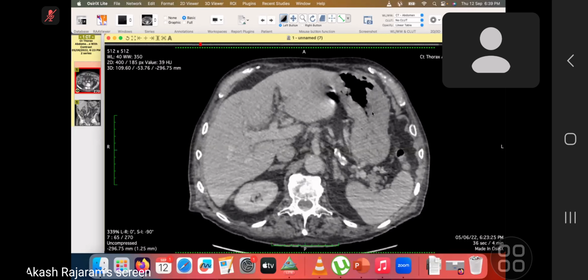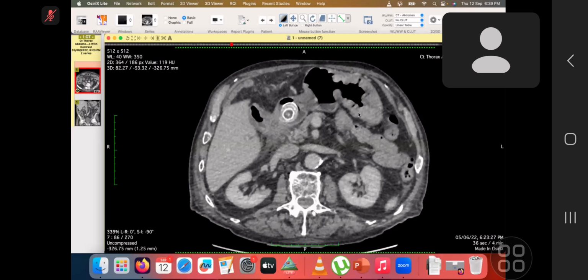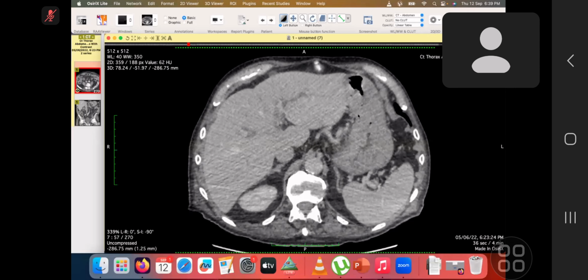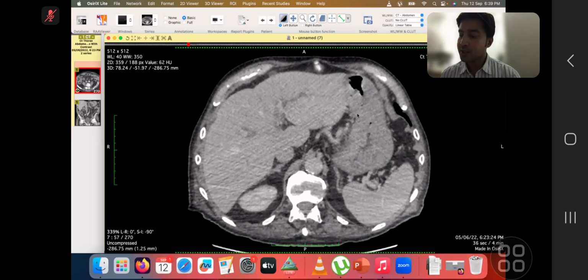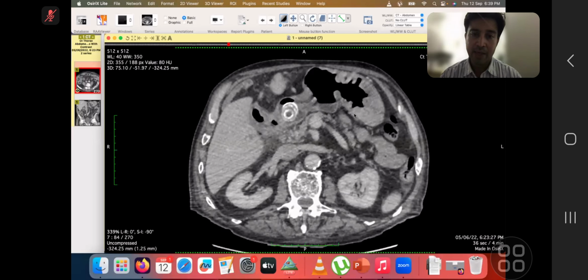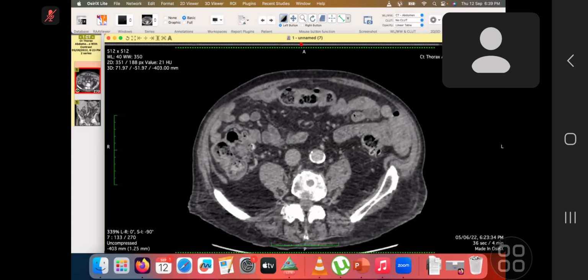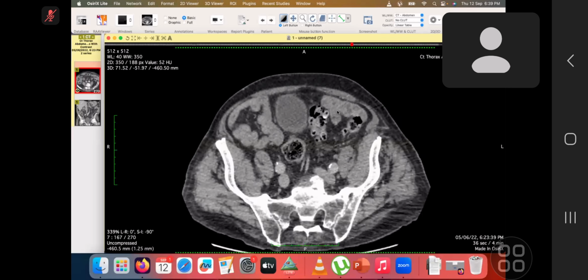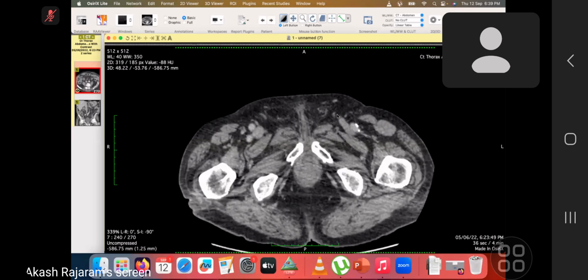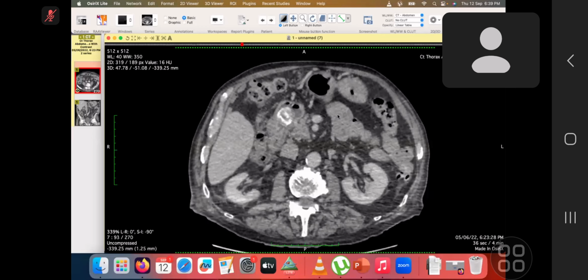So I'm presented with a contrast-enhanced CT of the abdomen and pelvis. Just going to scroll through the images. Okay. So this patient has some pain in the abdomen and some vomiting. Sure. So on initial scrolling through, I've noticed a rounded calcific structure within the pylorus of the stomach. I'm just going to scroll back up to it.